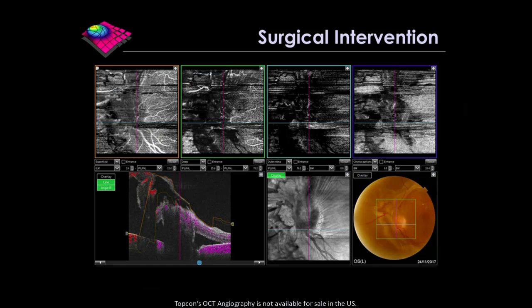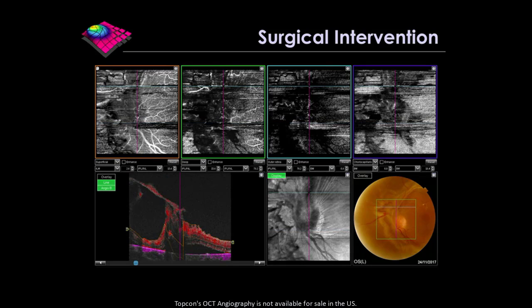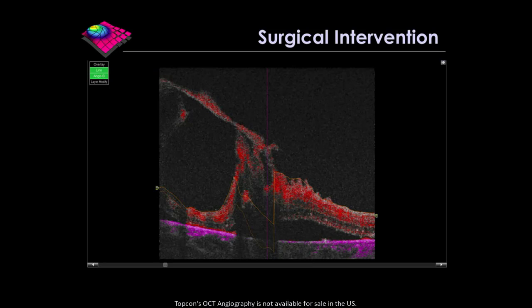So, as an aside, look at the angiodisc on this woman. Now, what this alludes to is the fact that the en face images don't always show you the beautiful neovascularization, because if there's a tractional detachment, the anatomy is so distorted and the segmentation gets confused. But you can still get clinically meaningful information, because actually look how angry and perfused the neovascularization is on the disc. And in fact, if we zoom in here, you can see quite how much flow is there.